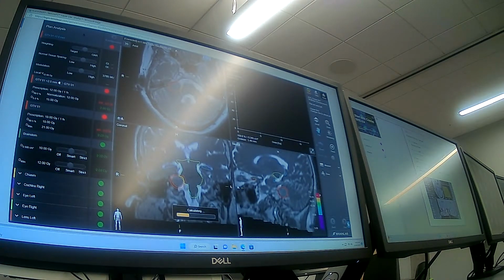Yeah, you just play with it. And see, the challenge is that every tumor is different, right? Whenever I get a new stereotactic patient, I immediately scroll through the MR to look at where the tumor is. You gotta go past the top right there. Oh, there it is.